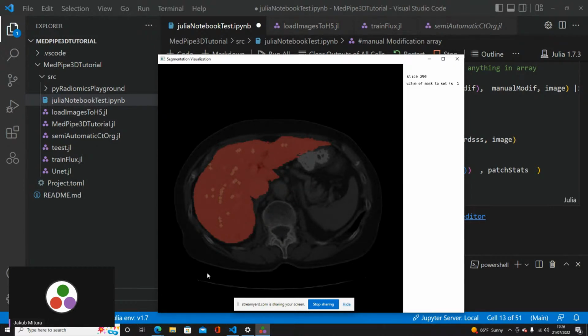Apart from this one that you see. Yes, so when we scroll, each time we scroll, the new data comes in. Just the data about a given slice, just one slice, is living in the OpenGL context on the GPU. So it does not take a lot of GPU memory. It should work on basically any GPU, even integrated.